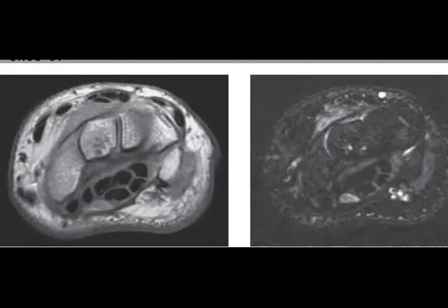So it can come to you with compression, flattening, change in morphology of the median nerve, edema, or in the post contrast, enhancement of the median nerve. And the most specific is that you find an abrupt change in the median nerve. So what would you like to mention after all this?